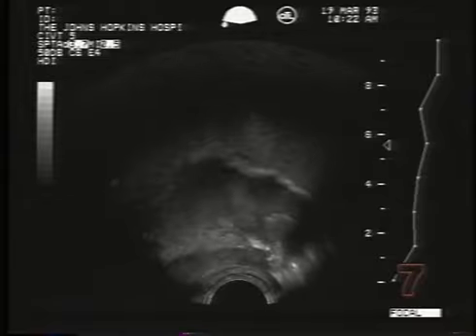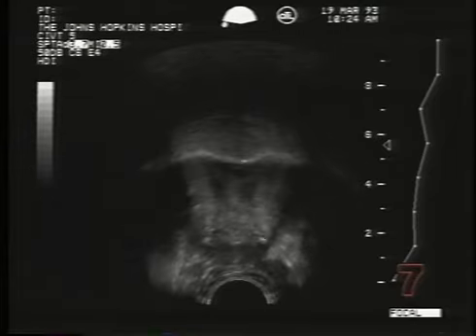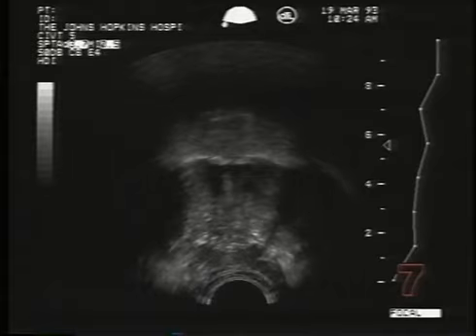Because the tongue is composed entirely of soft tissue, whenever it moves, it also deforms. Looking now at the cross-sectional surface of the tongue, the bright white line is again the surface. The left-hand side of the tongue is on the left, and the right-hand side on the right. In this plane, we can also see the tremendous complexity, showing the compression and extension of different portions of the tongue. Well, actually, we know very little about the inner workings of the vocal tract.